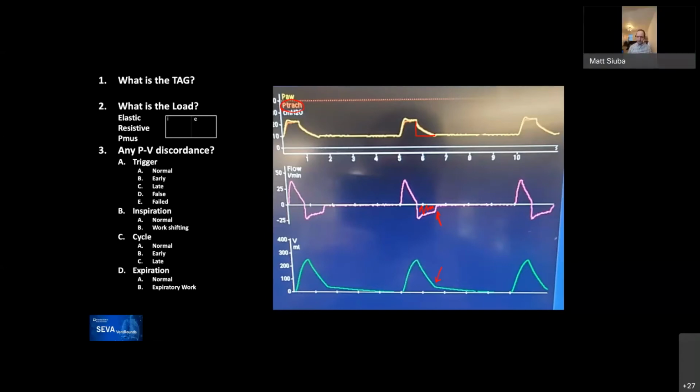So essentially we're saying that the valve generates a bit of resistance and then it just pops open, releasing the resistance suddenly. Looks like it. Yeah, that's what it looks like, sticking closed for some reason. Yeah.